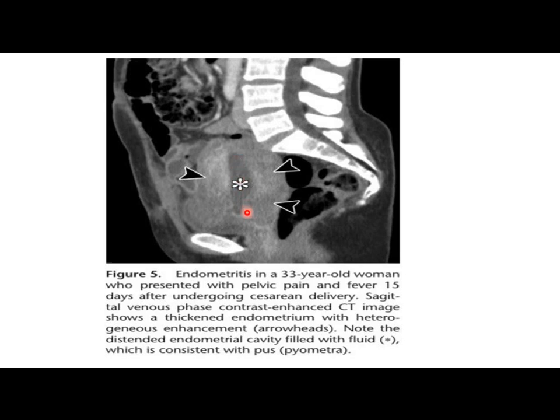So without the clinical complaint, this could be normal. Yes, without history, without fever or pain, nothing refers us to endometritis. In any situation this can be considered normal, because the endometrium is about 20 millimeters thick. It's all endometrial cavity. No, this is the endometrium. No, this is all the endometrial cavity.